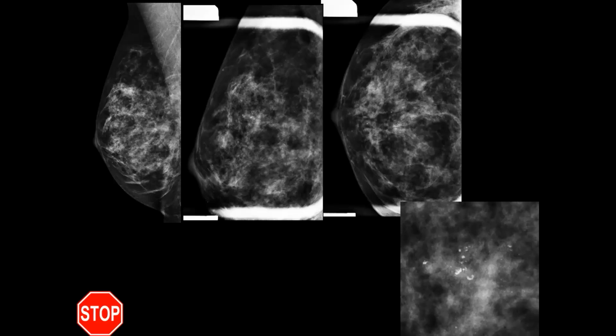So these are pleomorphic calcifications, and they're caused by usually high-grade DCIS with comedonecrosis. And again, necrosis, when things are benign, they tend to push and grow very uniform and look very symmetric. When things are malignant, there's invasion, there's necrosis, it's irregular, right? And so that's what this is.